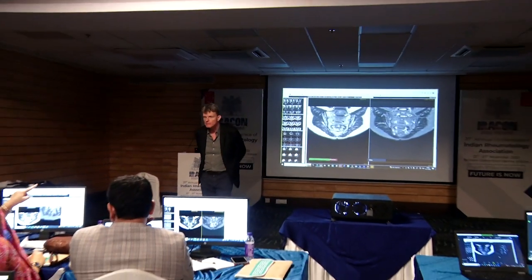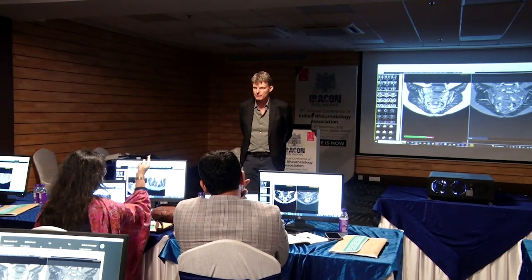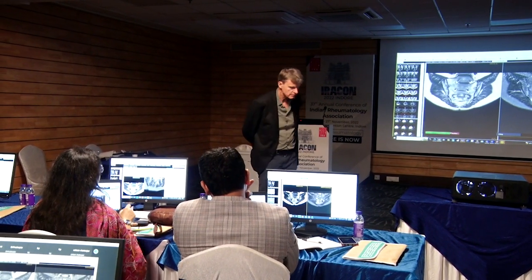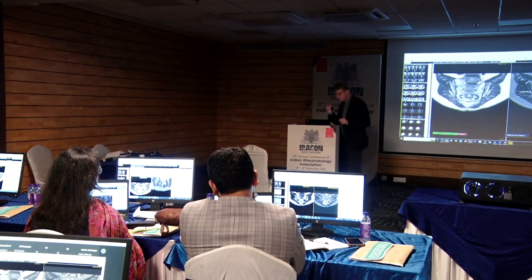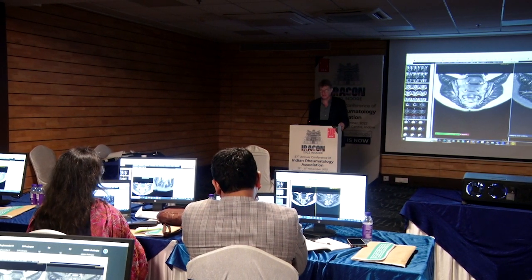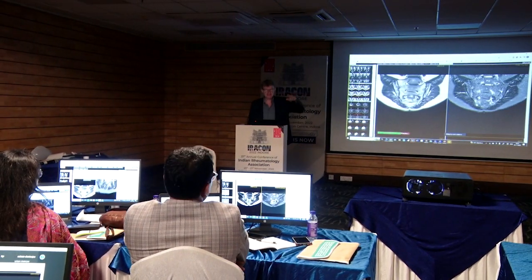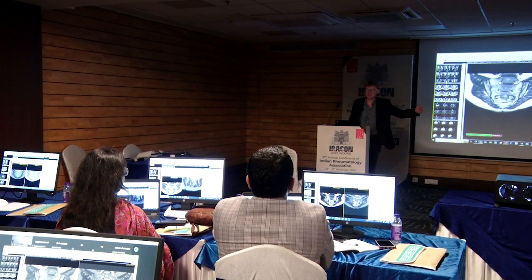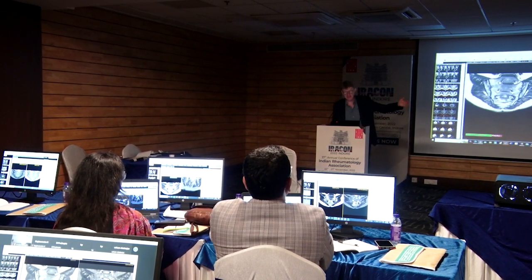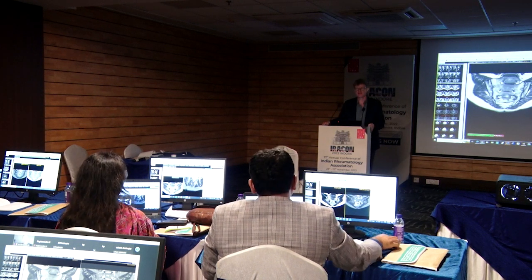The backfill which we are committing, we have to point out that the original erosion from where the backfill happened is at the top. So you ask whether we should be able to see where the erosion had been. Right. The challenge is that in the case I showed, we had two sets of images, and then we could show the nice erosion first, and then see that it was filled in afterwards. But in clinical reality, you don't have that.